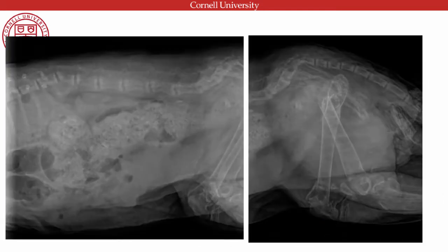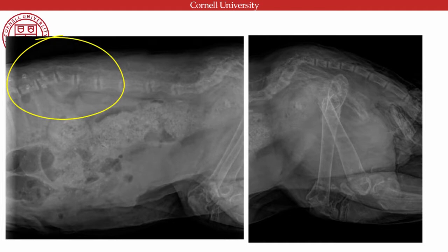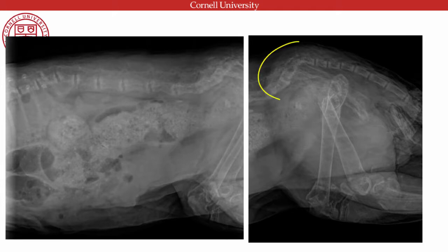The spine is also not great. So she has these wedge-shaped vertebra, probably crush injuries as well, and this sort of sharp angulation, and we can see this angled spine here as well. So she has these bendy-looking vertebra, and again, diffuse osteopenia. It's really hard to make out her spinous processes. She's got a very, very fine line of where the lamina should be. So really quite a distorted vertebral column. And then we can see those femoral fractures down here.